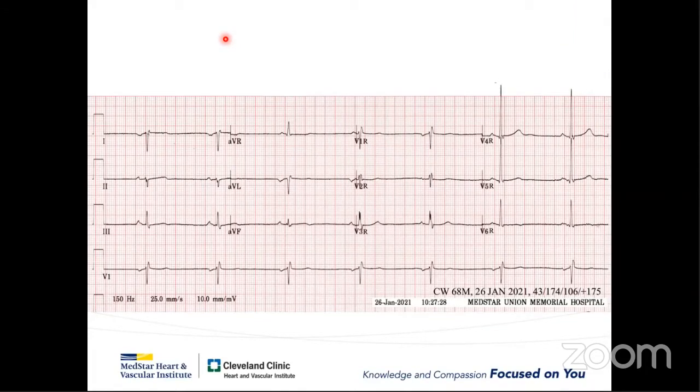I'm not confusing the people. Actually, when you think it is dextrocardia or a reverse arm ECG, sometimes you need to change your limb leads also, so that you make sure to compare with the previous one. Yes, it is definitely dextrocardia, no question about it.